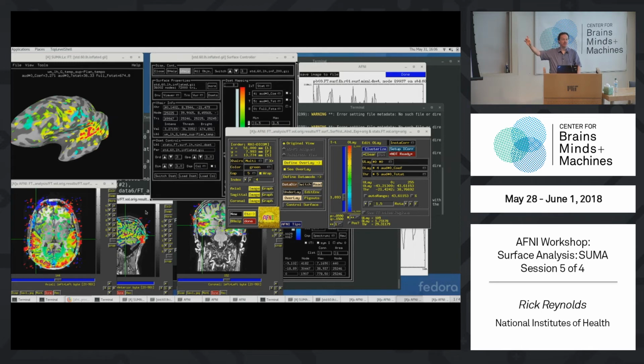At least with this subject, the surface is in the right place in the volume. And so the mapping from volume to surface is correct, except it was done after volume processing instead of after surface processing. So it's really just the blurring that's different. The blurring was on the surface rather than in the volume. That's really the main difference.